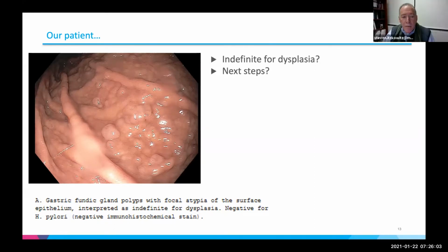Yeah, because this looks like an FAP type stomach with the multiple polyps, but I have seen this exact picture even with indefinite dysplasia in people on PPI. So that's the first, second, and third thing: I would wring his neck and tell him to fess up about taking PPIs. Was the antrum spared? That's the key. With FAP, the antrum is always spared. Yes, there was no polyp in the antrum.